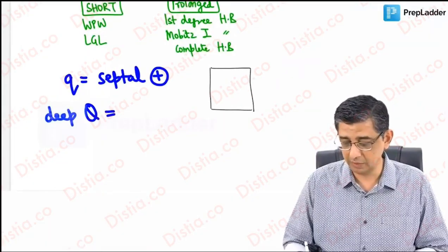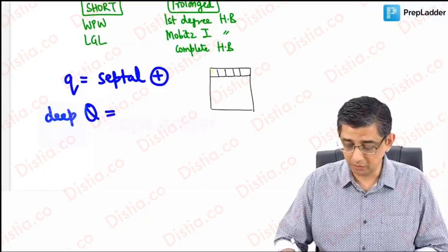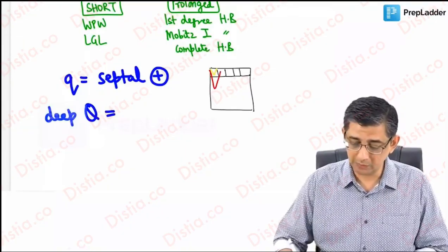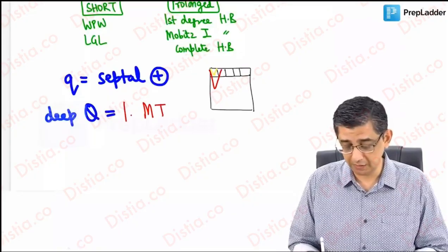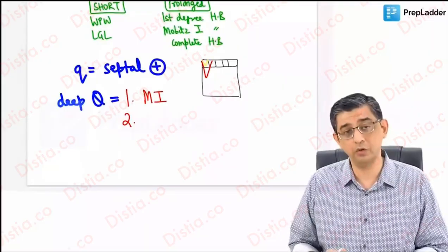If this is one large square, there would be 5 small squares, each having a duration of 40 milliseconds. Now I'm going to draw a Q wave in slight yellow color. It fits into one small square. Now I draw an abnormal one which is spilling out of it. The first condition having this is myocardial infarction. In fact, deep Q wave in MI signifies cell death, and this finding will persist for the whole life of the patient. It's never going to go back.